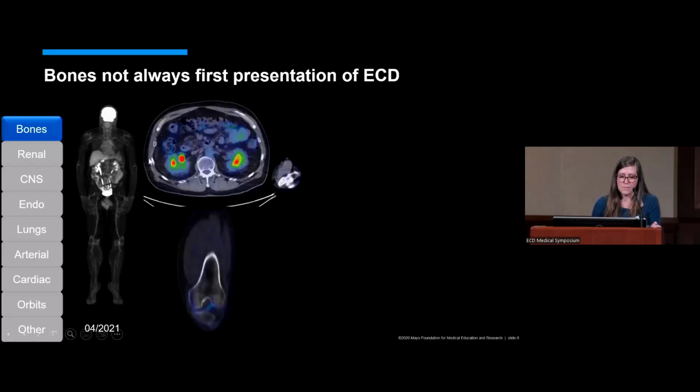There are the hairy kidneys, some ill-defined soft tissue stranding around the kidneys that have some mild FDG uptake. And as you can see in his bones on this whole body MIP, there's no FDG uptake in the distal femurs, and also on this coronal CT image or axial or coronal fused image, you can see there's no sclerotic lesions.